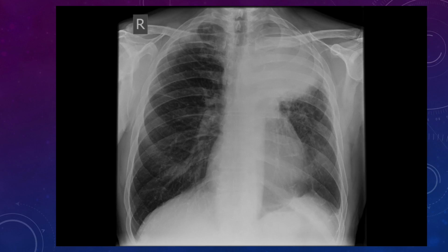And when you get this sort of appearance, if this was your shoulder film, I'd be expecting you to have a look at the rib density as well. Are the ribs intact? Are the posterior ribs intact? Anterior ribs. You might find you've lost the posterior ribs, which tells you it's a posterior lesion. Okay, so you start to think about that. Also, you might take into account a few more subtleties. Maybe some axillary clips. Maybe it's a breast cancer patient. Might have had a mastectomy. Okay, have we got a destructive bone lesion? Have we got recurrence of the breast cancer? It's about taking all these little things into account.